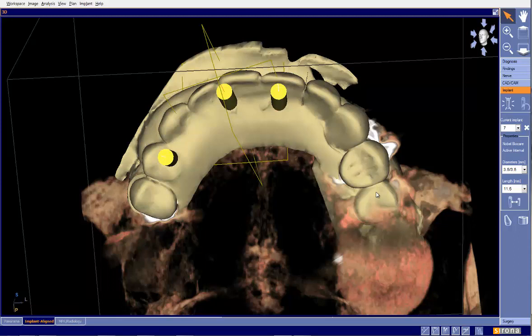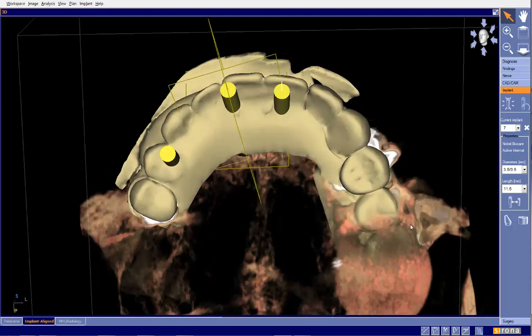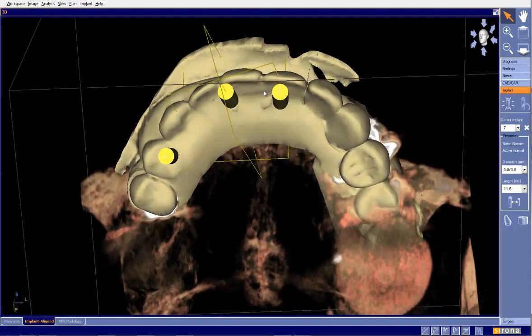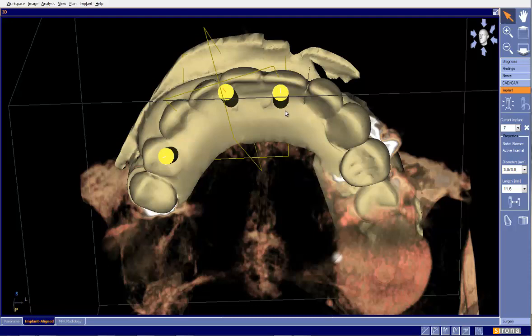So one of the things I like to look at when planning overdentures over partials is the ability to keep these pretty parallel to each other. I know they have extended range, allow 20, 30 degrees of divergence, but those just aren't as good. But to be able to keep something relatively parallel, maybe 5 to 10 degrees maximum of divergence. So the first thing I'm going to look at here is we are probably pretty close based on this right here. Again, it's very hard in the anterior compared to the posterior to create that angle, to maintain that parallelism. But I think as we go through this, we may be able to achieve that quite nicely.